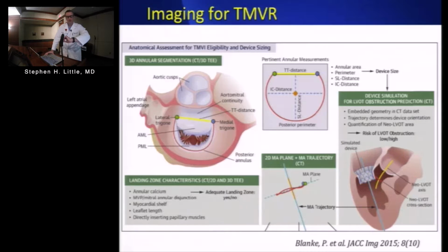So we went fairly quickly through a lot. I wanted to show you some cases, particularly where echo and TE can be helpful, and emphasize that the frame rate issues with color are a limitation, but that doesn't mean the data is useless. In the right application, it can be very helpful.